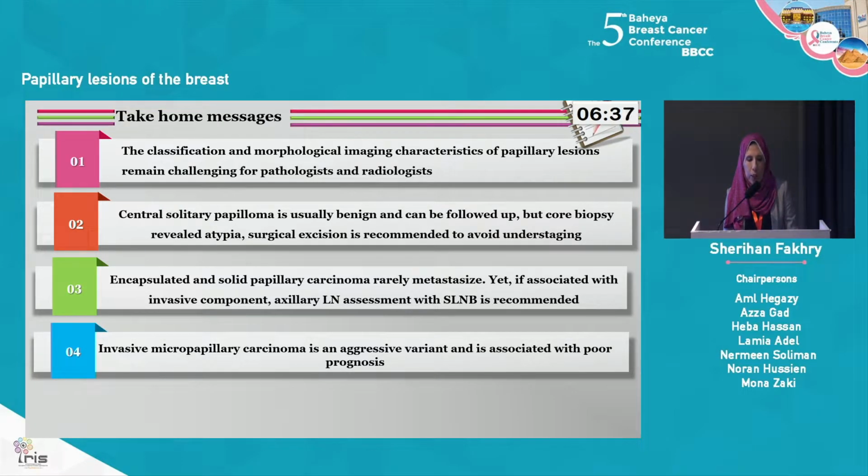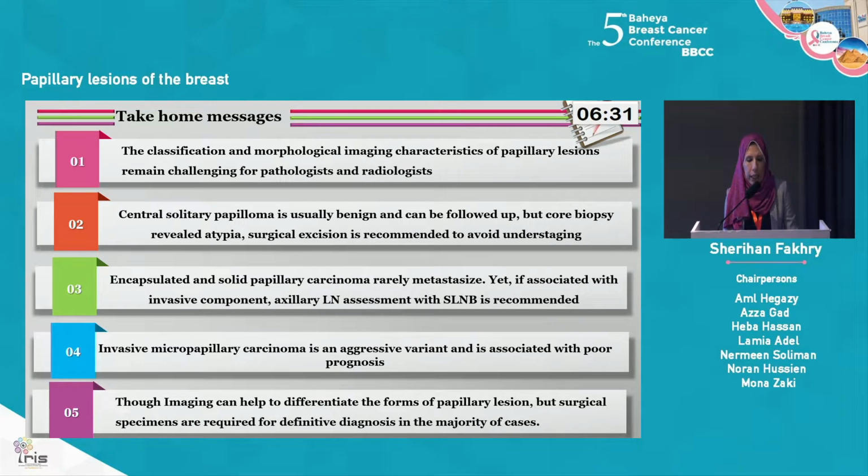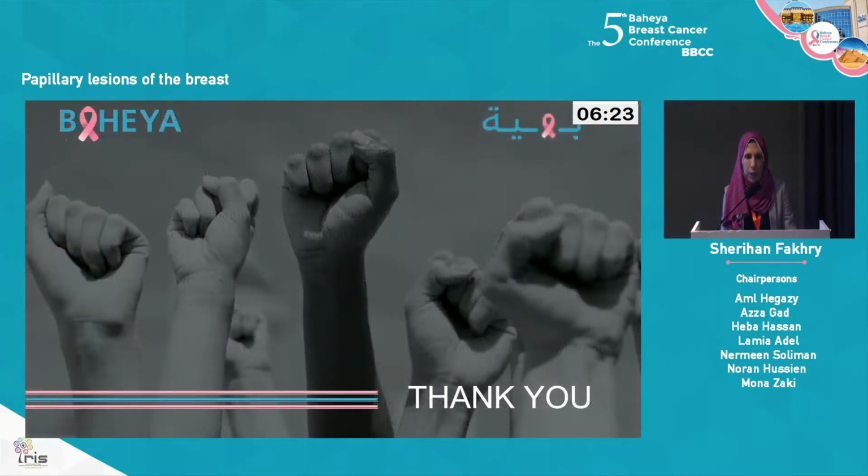Invasive micropapillary carcinoma is an aggressive variant and is associated with poor prognosis. Though imaging can help to differentiate the forms of papillary lesion, surgical specimens are required for definitive diagnosis in the majority of cases. Thank you.